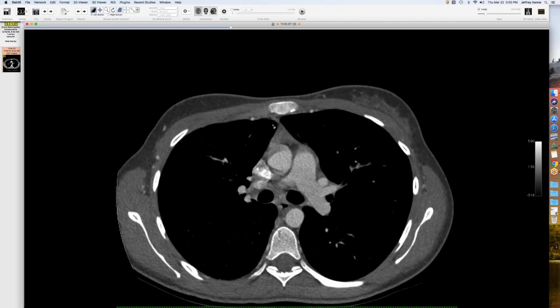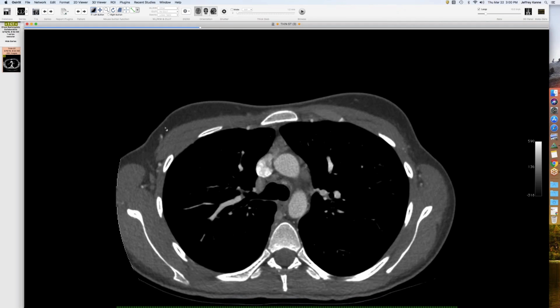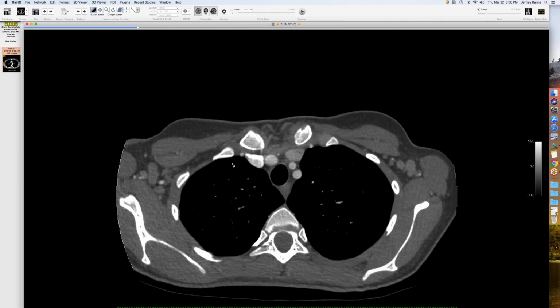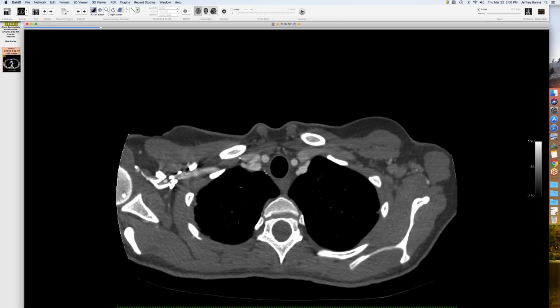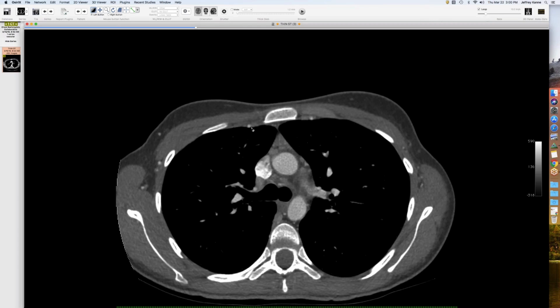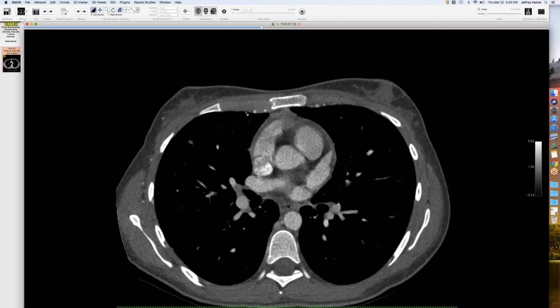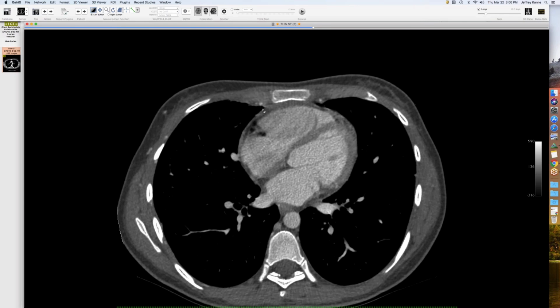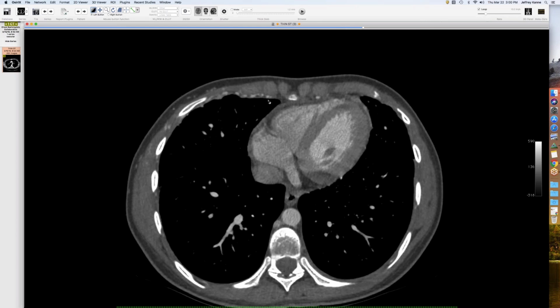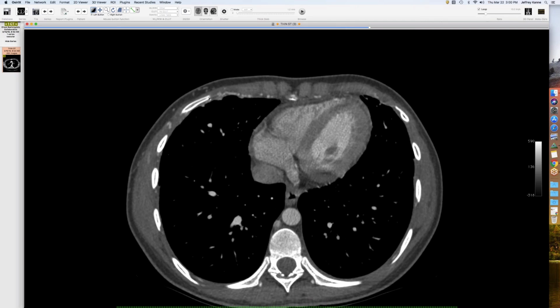Even in her right breast there, you can see there's a superficial collateral that dives down too. Recruiting stuff, but if you can follow it all back to the internal mammary artery, because there it is, and you see how big it is. It's a really juicy vessel, and these all are coming off of this vessel here, so it's not pulmonary venous arterial drainage to the systemic veins, but rather all these little branches. So I think it's because of higher pressure. I think it's coming from the outside in and probably just mixing with the pulmonary artery.